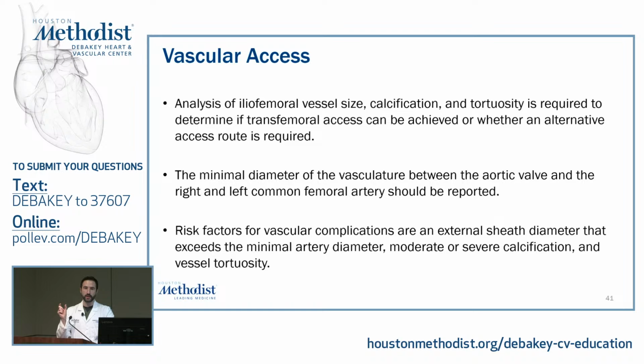When you report the iliofemoral dimensions, you want to report the minimal diameter of these access vessels. Risk factors for vascular complications are an external sheath diameter that exceeds the minimal diameter. So if you're using a bigger sheath than your arteries, that can lead to vascular complications.